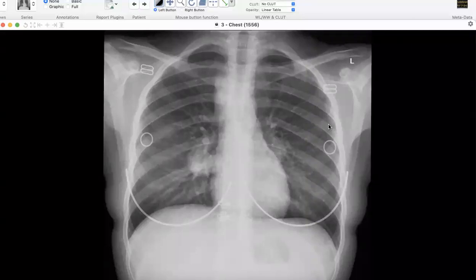I would like to see also the bony structures. I can't see anything remarkable in these structures. Nothing beneath the diaphragm or in the other hidden areas. So my striking abnormality here is the right hilar mass. And there is some prominence in the right paratracheal area also.